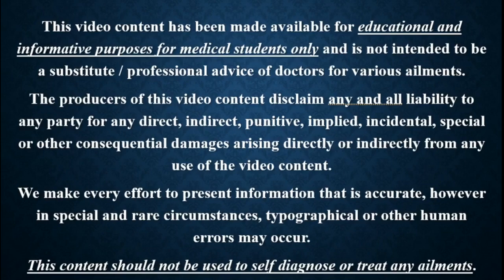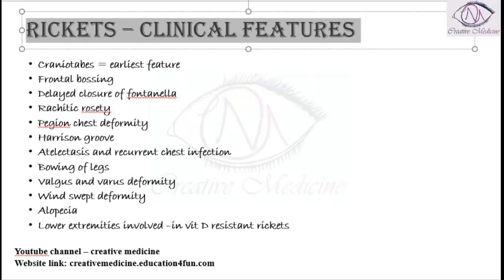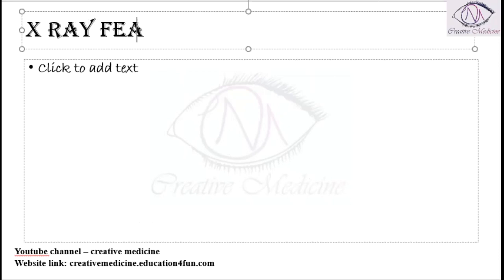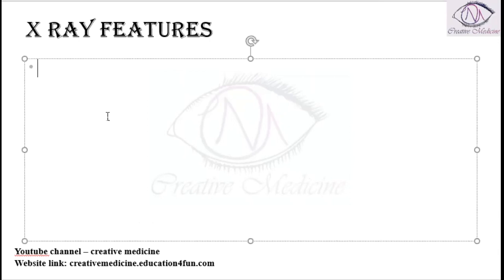In this lecture, we will learn about X-ray features of rickets. In X-ray features of rickets, we have fraying. Fraying is the loss of the provisional zone of calcification of the metaphysis.